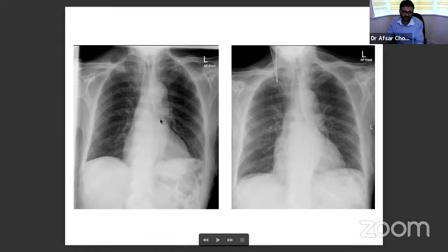And this X-ray was one Dr. Riaz was doubting. If you see that in the first attempt it has not gone really down in the stomach, and you have a doubt whether it is in the lung or in the esophagus, whether we should withdraw and push or you can directly push. In those cases, you can always identify the left main bronchus here. If it is going into the bronchus, definitely it goes along with that. And the bronchial division starts just before the hilum.